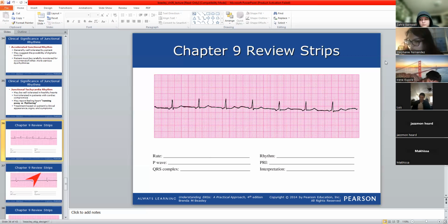You multiply this by 0.04, so it will be 0.12, right? So put the correct number. Don't say it is less than. Just correct the number. You did your job. So the PR interval and then the QRS. They're all narrow. Very good.